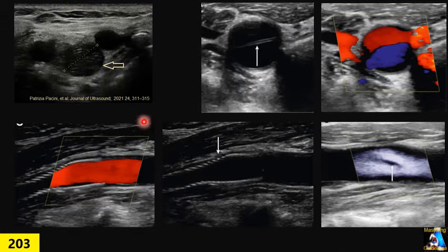First, lymphadenopathy is another story and has a specific characteristic. Another one is carotid body tumor, which is not common, but you may see it, especially when it is isoechogenic between the ICA and ECA branches. Always be aware of that.